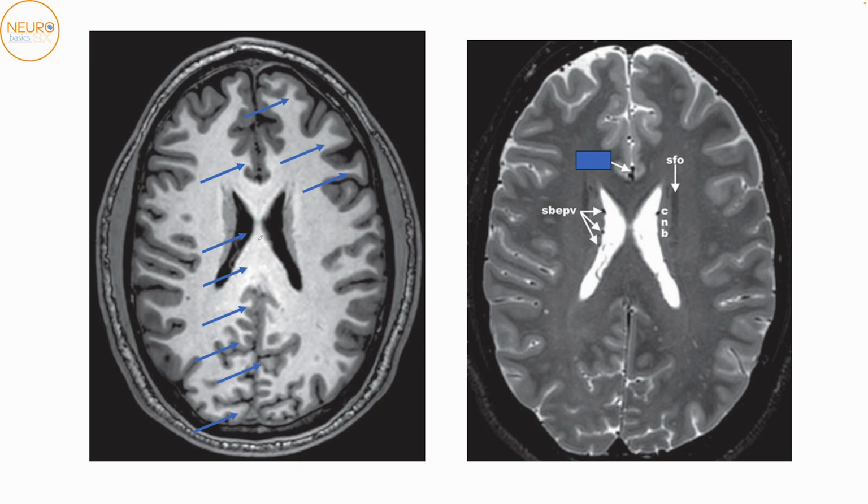Okay, in the next step we have gone a little bit more inferiorly and we're able to see more obvious structures. This lateral ventricle has become clearly demarcated now, so you can make out the body of the lateral ventricle quite nicely. There's some gray matter which runs on the side of the lateral ventricle, and this is the caudate nucleus. The caudate nucleus anteriorly will have a head, and then in the middle along the body of the lateral ventricle it has a body, and then it has a tail which wraps around and enters the temporal horn.